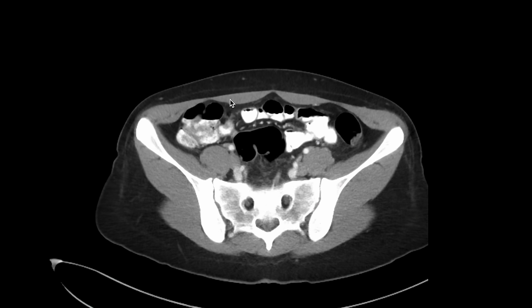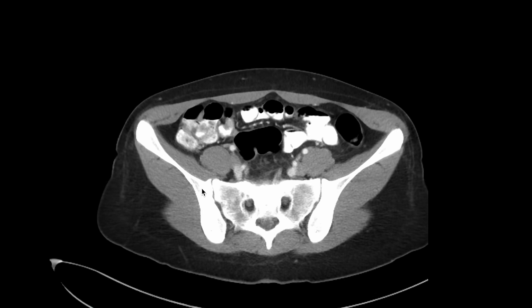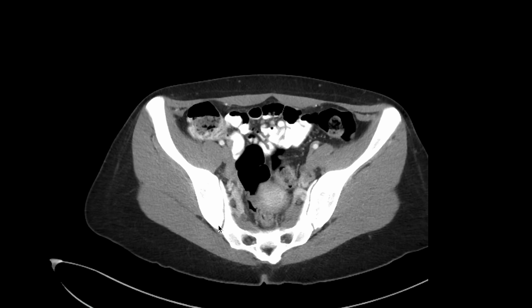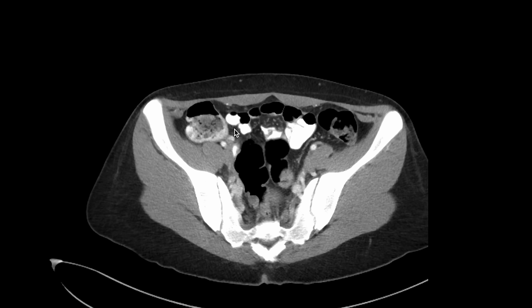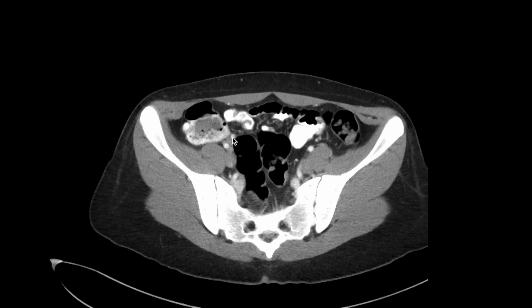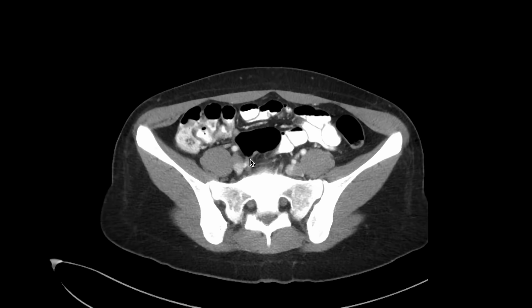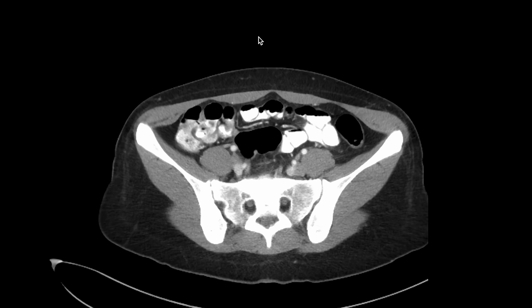I'm specifically looking along this margin here at that location, the cecal base. And if I scroll down, sure enough, you can see that in this patient, this is the appendix here, it arises from that same aspect. And I can follow it up now and see that it's normal and filled with contrast with no inflammation around it. This patient does not have appendicitis.